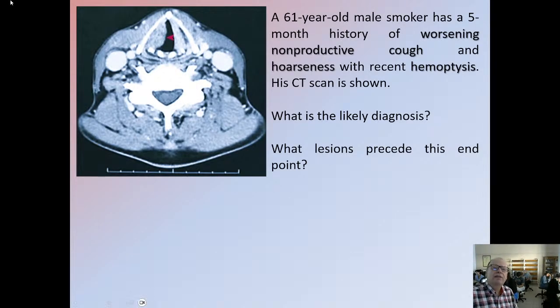Oh, have a look at this larynx. What are the anatomical compartments of the larynx? We have the glottis, where we have the vocal cords. Those that are upwards, close to the epiglottis, are false. Those that are down, close to the subglottis, are true, meaning that they have muscle.